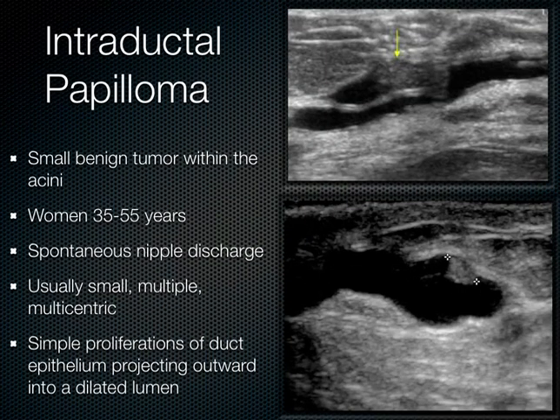Now moving on to malignancies and other masses, this is an intraductal papilloma. These women come in with spontaneous nipple discharge. It comes from a single duct. Usually the discharge is copious, which is usually preceded by the sensation of fullness or pain in the areola area, and then when that fluid comes out, when it's expelled, there's usually a relief of the pain.